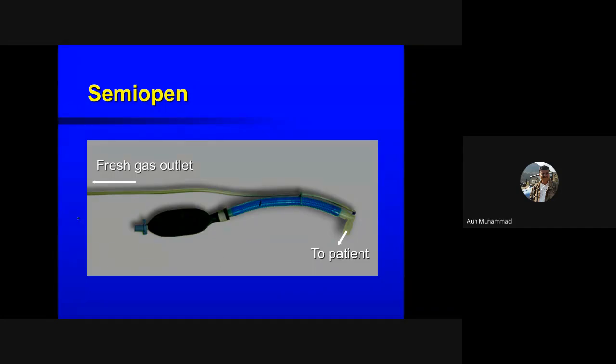So what we have is a tube that can carry the oxygen or the medical gas, right? And that is directly connected to the patient. This tube can be connected with the endotracheal tube, and we have a reservoir, so the extra oxygen can be stored, so we can access the pressure of the system for this reason. But for the patient, there is no channel.